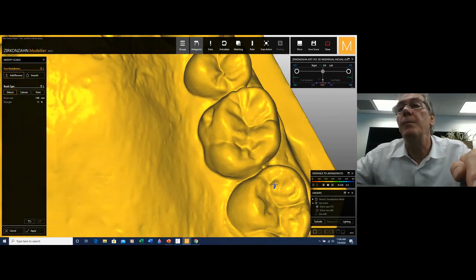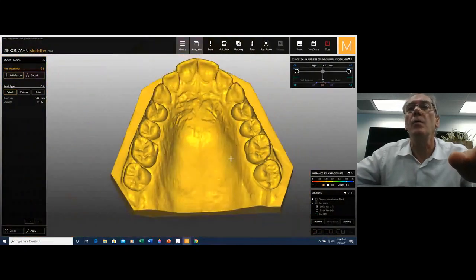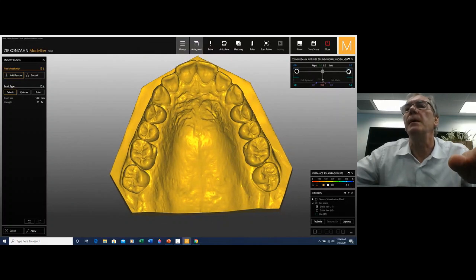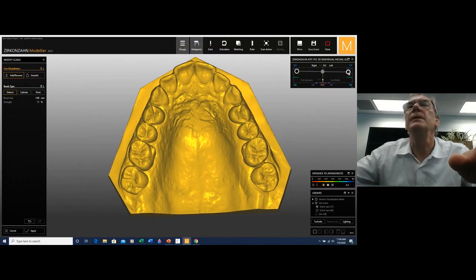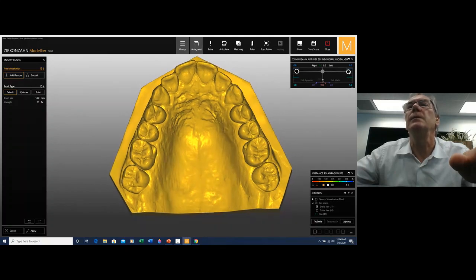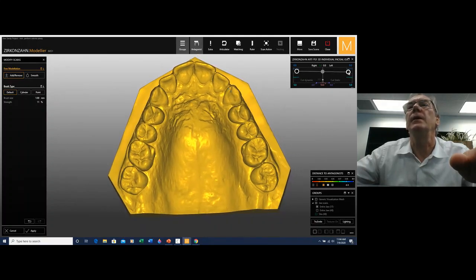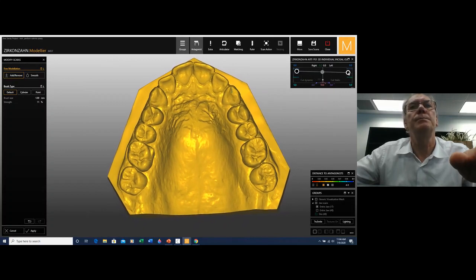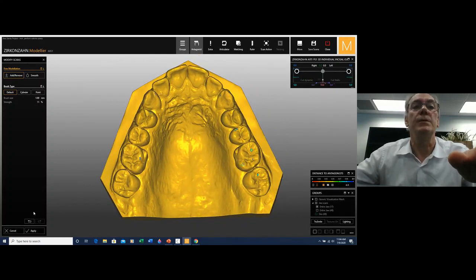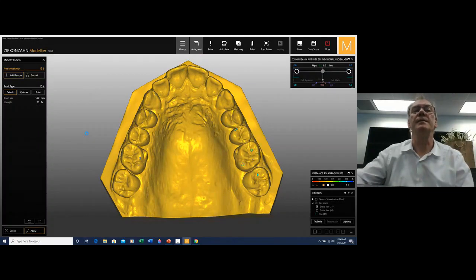Now you're going to have to map all these touchings, right? You have to map them on a piece of paper. You can record them directly from your computer, so you can remember each single movement. Here we're doing good. That's the only contact. 1, 2, 3, 4, 5. Okay, it's not much. We're pretty close to what we're looking for. Now we need to apply whatever we have done.